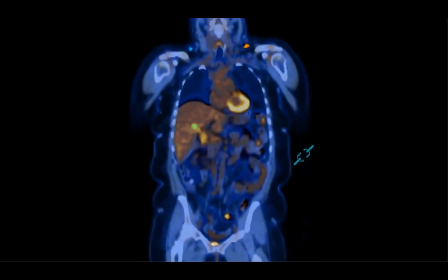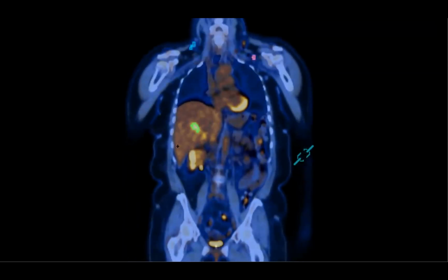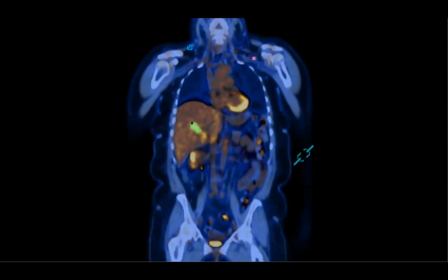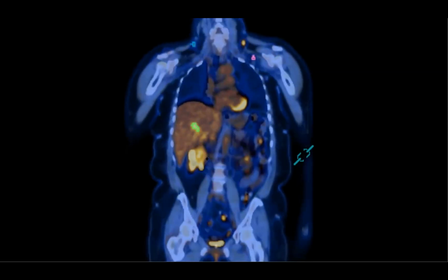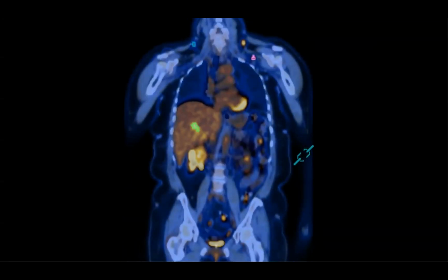What's happening in the bile duct, or what's that green thing in the liver? Oh, they marked it. This is outside imaging, so I'm actually not sure what's marked over there. Maybe it's part of the systemic process. Does this help, Nelly? I know lymphoma can be super FDG avid, but I feel like urothelial probably can too.